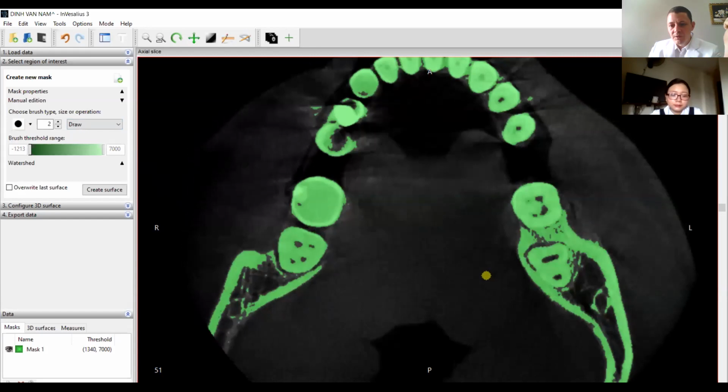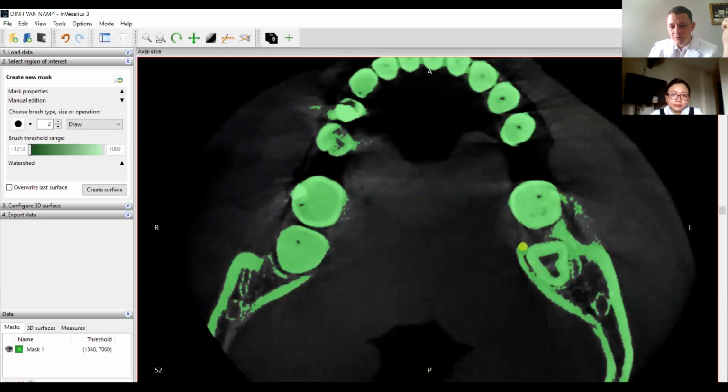Yep. So I don't know. Let's say, oh, here I have bone. I want to see my bone.